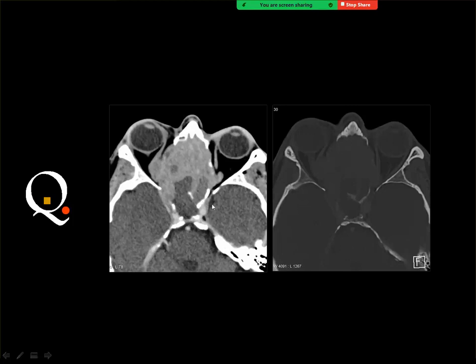You know that most of the paranasal sinus tumors are squamous cell type, and few are of other types, but you should mention first that this is a carcinoma. If you are asked about the differential diagnosis, you mention this may be sarcoma or lymphoma or metastatic deposit.